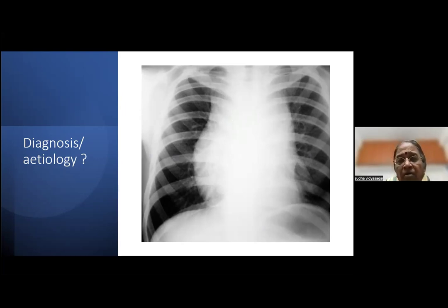Now, no more go and call it tuberculosis. Don't call it all that. They do not infiltrate any of these structures. A malignancy does. So remember that when you have a superior mediastinal syndrome with a mediastinal widening, you have to call it a malignancy. Okay.